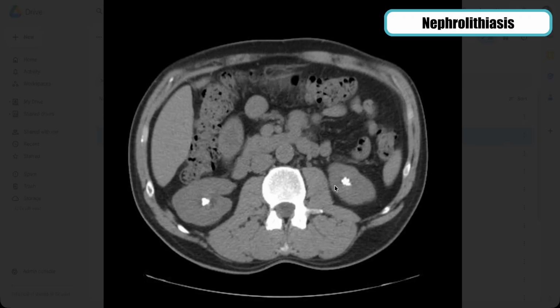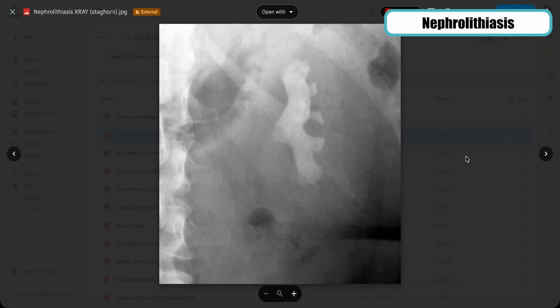So we're looking at both kidneys here, and they got these bright white patches in each one. Bright white means very dense, could mean bone, or in this case, calcification. Here we've got a very zoomed in image of an abdominal x-ray. Orient yourself with the spine here on the left side of the image. If it's flipped, then this would be the left side of the patient.